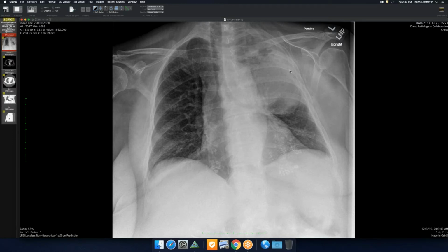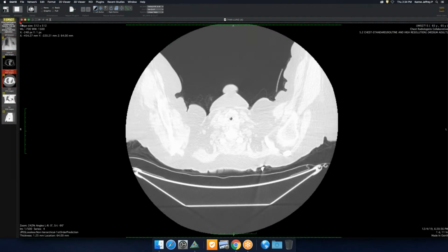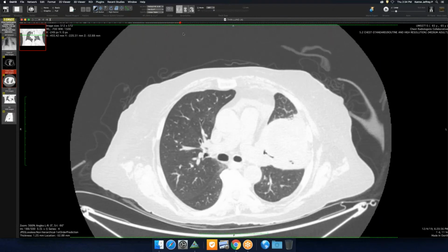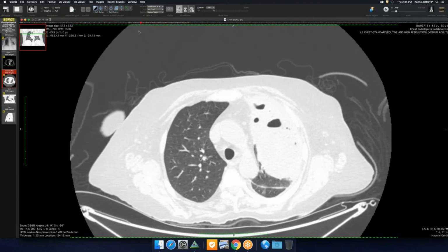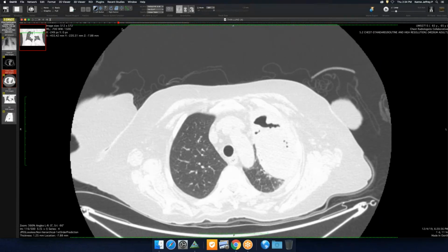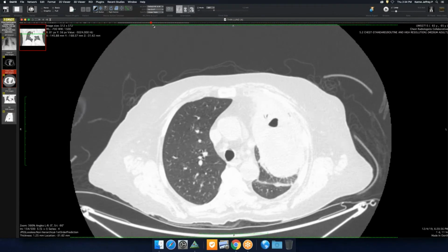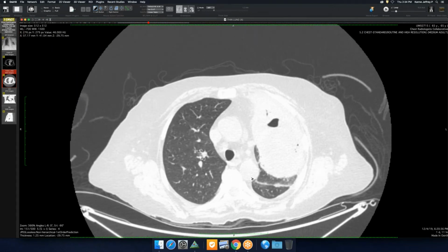So it might make you think, could this be an abscess? Alternatively, this could be a big neoplasm that's causing some esophageal dysmotility, but it's something we don't see a lot of on imaging. This ended up being a polymicrobial abscess, but it was quite large. And you can see even here, Howard, there are a few septal lines around it. It may be big enough that it's compressing the vein, and I think you see some subpleural edema along the fissure as well.